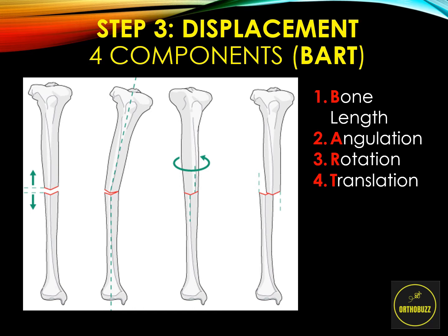The second is angulation, and this describes how one fragment of the bone distal to the fracture relates to the bone proximal to the fracture, and it may be angulated, which can be described in degrees. The third is the rotation. Now, it's difficult to comment on rotation on plain film radiographs, which are 2D images, but there are certain clues that we can look at, especially certain bony prominences, which may be visible or may not be visible depending on if the bone has rotated.